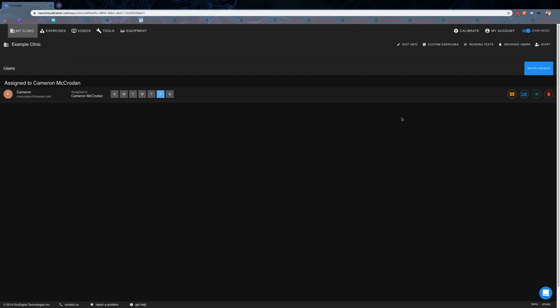I've been asked to do a walkthrough of the NeuroVisual Trainer app, so I just want to take you through what we've learned over the last number of months of use, and hopefully you find it helpful so people can get up and running quickly.